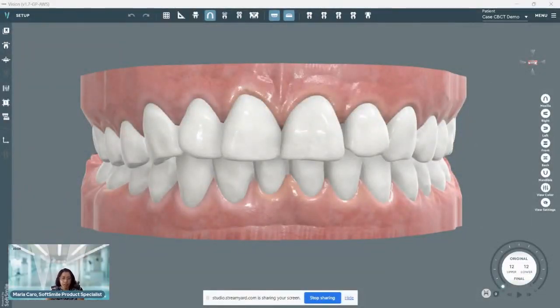We will touch base on why he selected to integrate CBCT for the treatment of this case, and follow with a walkthrough of the CBCT integration and where the CBCT files can be added when we create a new patient in Vision. Then we'll go through a step-by-step progress of the case in the pre-processing stages until we can see the visualization of the real roots render once the CBCT images have been processed.